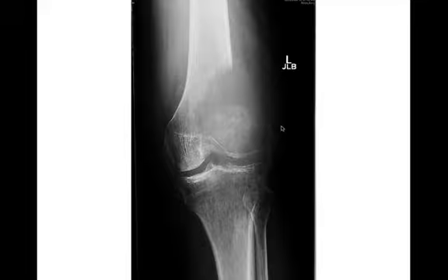And if you remember, giant cell tumors originate near the physis and will grow to the articular surface and tend to be eccentrically located. So this would be good for a giant cell tumor as well. Other differentials you could think of in this case would be telangiectatic osteosarcoma, which could look like this as well. And in an adult or somebody older than 50, things to keep in mind would be metastasis or plasmacytoma or multiple myeloma as well.